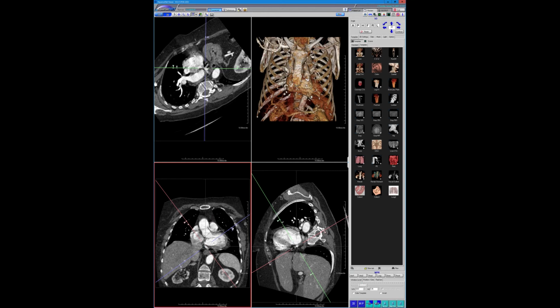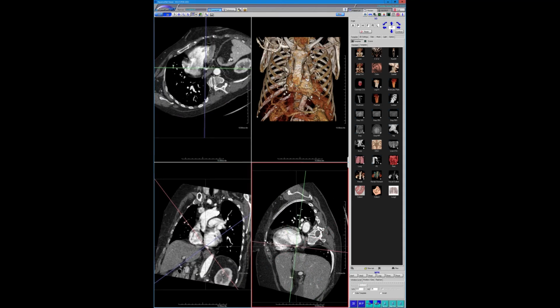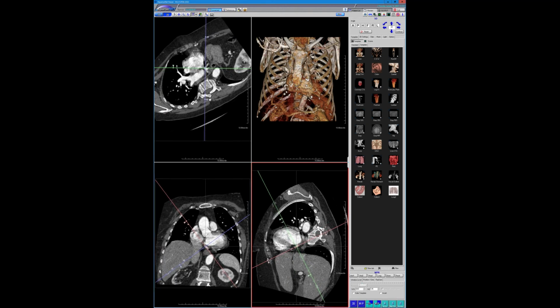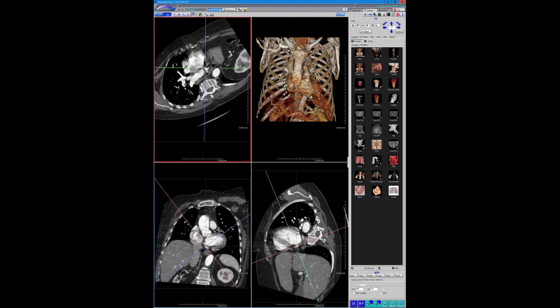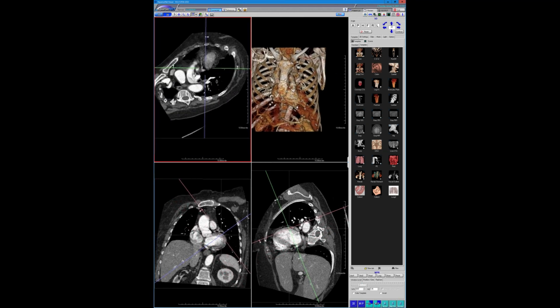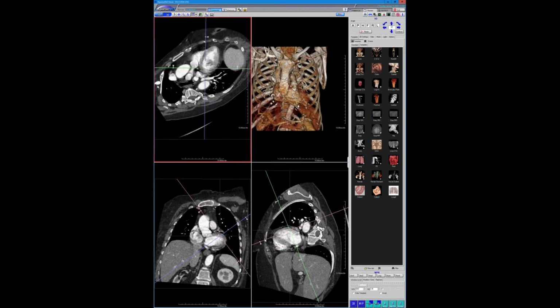But I think, as you probably read too, the one complication you can have is venous myocardial infarcts if that's ligated for some reason. I think that's the only one. And I don't know, maybe we should write up the collection of these that we have.